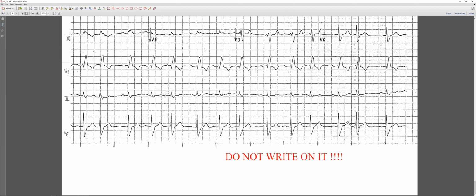Well, it's not wandering, because if you had a wandering pacemaker, you would see two or three of each morphology. You should see a continuous changing of the morphology, starting with, let's say, lead number 2, positive, less positive, then negative, and going back. It looks like the morphology is moving from the sinus to the AV, but here you see only different shaped P waves.